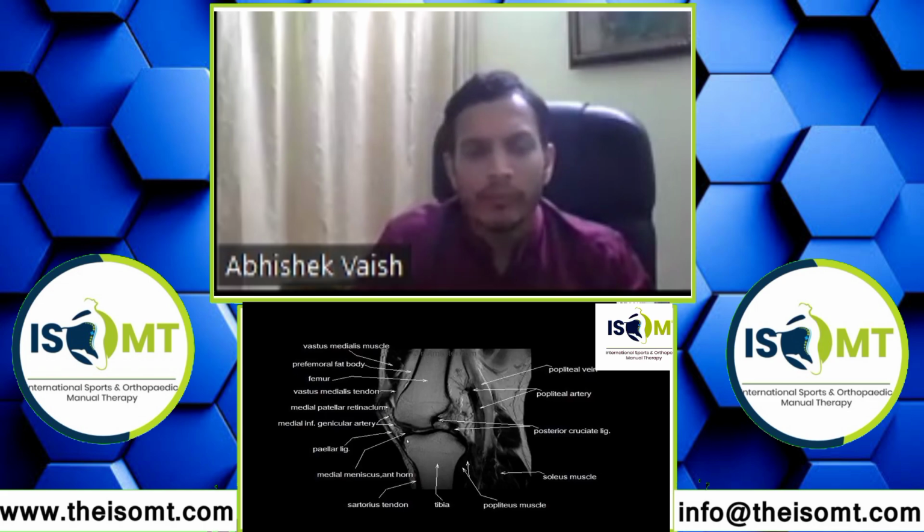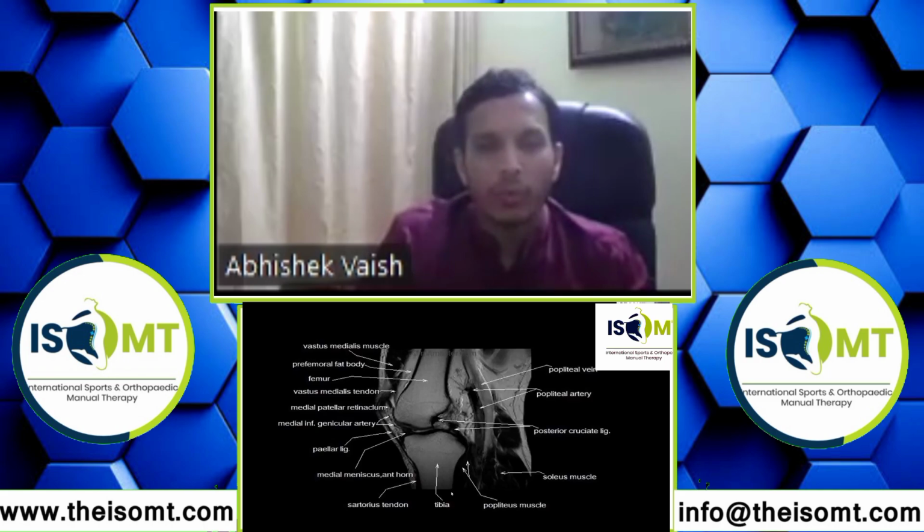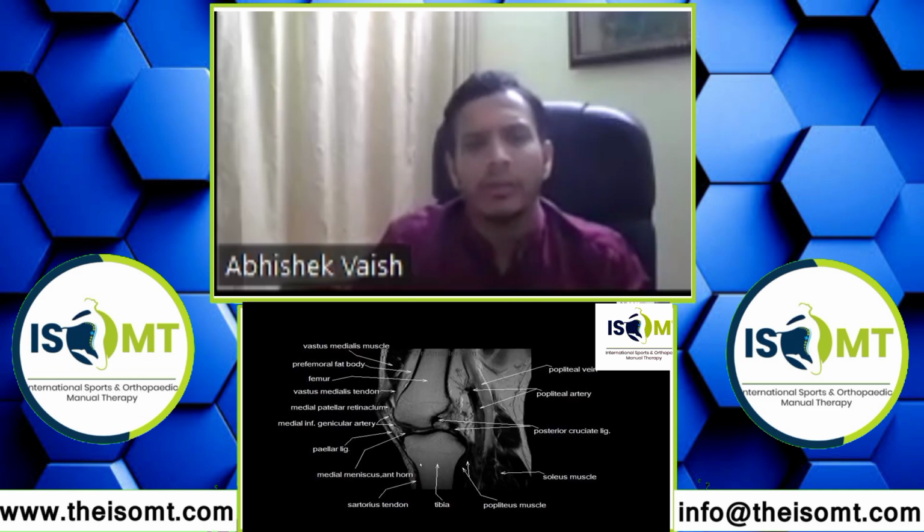One quick tip: when you are seeing this tibia, if the tibia is looking like a quadrangle, then you are in the lateral compartment. And if it is looking like a triangle, then you are in the medial compartment. That's how you can make out whether it's a medial meniscus or a lateral meniscus.